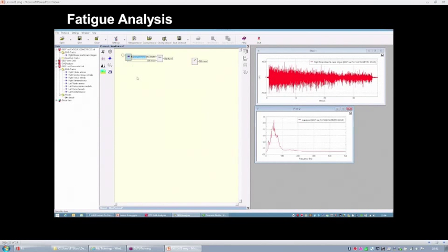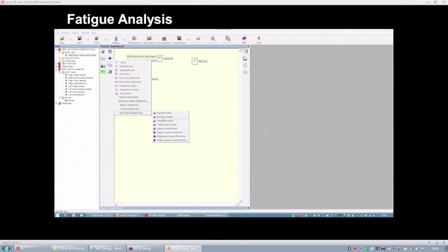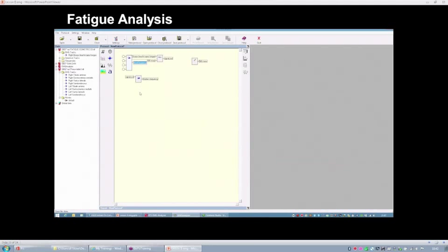So now we can, for example, compute the median frequency. And as you can see, it is around 50 Hertz, so 52 Hertz. So it's lower. The median frequency of this spectrum is lower with respect to what you have in a typical unfatigued EMG spectrum. So to compute the fatigue, you have two options. You have some different options in our EMGAnalyzer application.